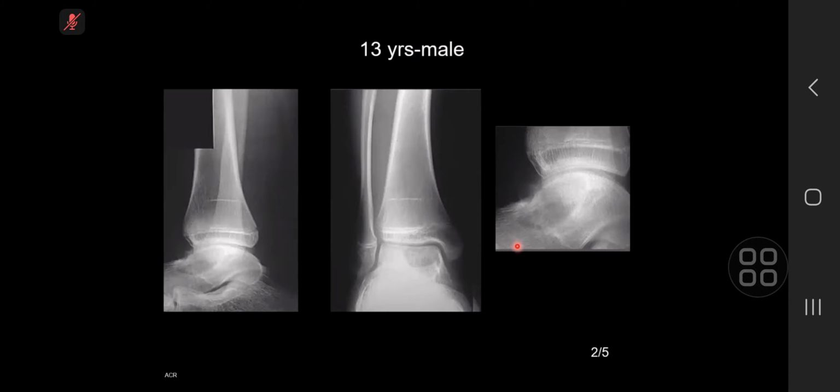In a patient of this age, this is most likely an epiphyseal kind of lesion, a single lucent lesion. So the ABC is arising from that pre-existing lytic lesion in the dome of the talus. I'm just struggling to find out what this primary lesion in the dome of the talus could be, and then from there the ABC is arising.